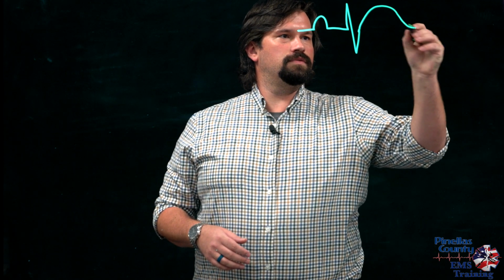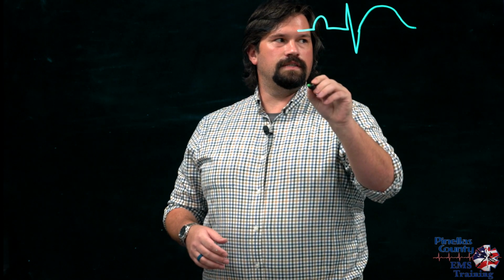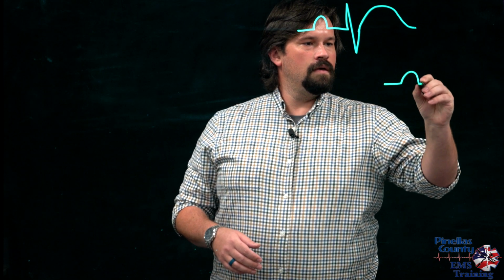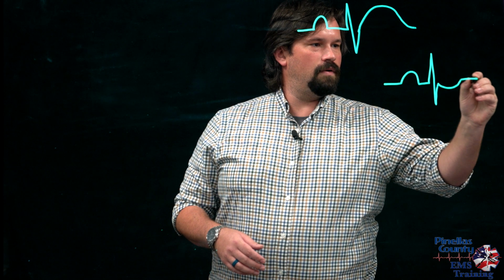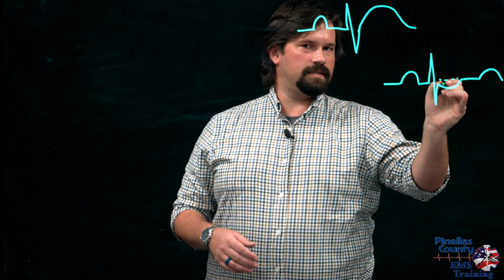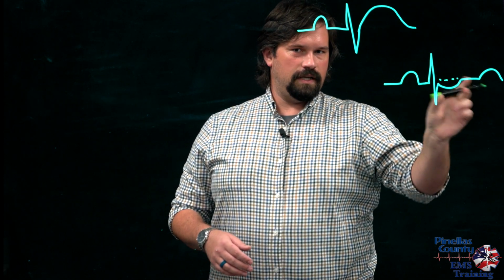So as we're going through, we have our normal EKG, and let's say that you end up having your tombstone, obviously a massive heart attack. However, there's another very subtle one that I want you to be aware of called the ST depression. So what you have is your EKG, and it ends up going back like that. So we have a depression from the baseline. So ST elevation, a STEMI; ST depression, an NSTEMI.